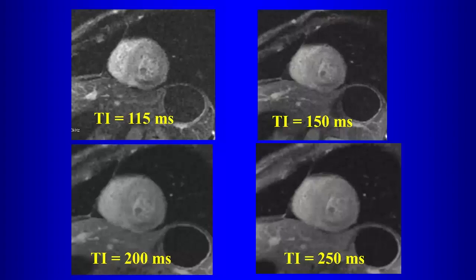Not T1, what is that? What are those letters? What does TI stand for? You guys want to help? Inversion time. So what is this slide showing you in this case?